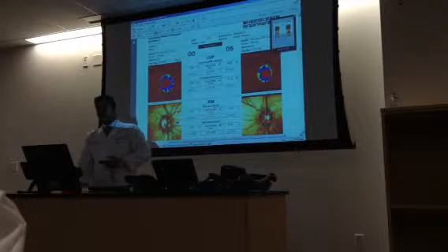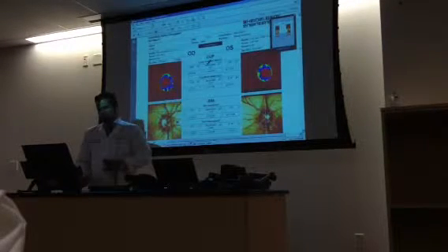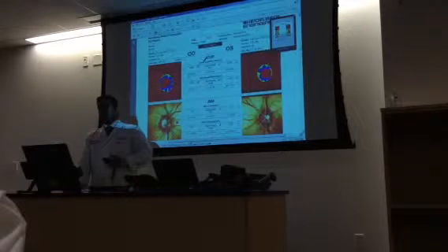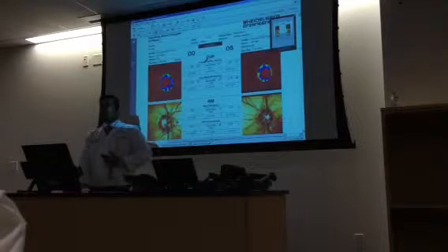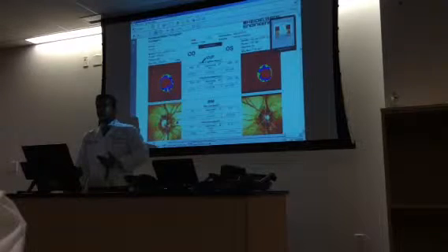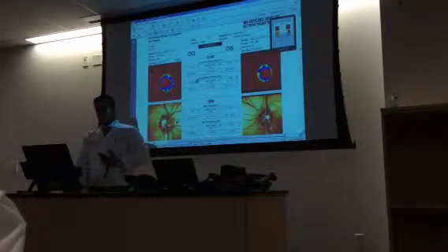Then you go to these parameters right here. Linear cup-to-disk ratio is a parameter that tells you about the cupping of the eye. It's the one number that tells you how much the eye is cupped. If it has a check mark next to it, it essentially means that it's normal, green check. If it has an X, then it's outside normal limits.